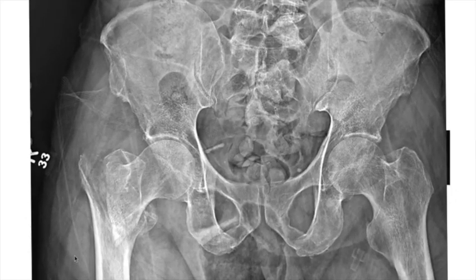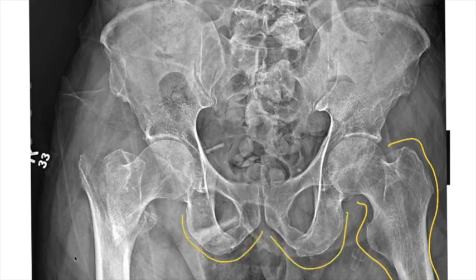Here's another example of a pretty significant fracture, and you shouldn't miss this. So if you look at the normal side, and again, you're going to look for smooth borders. Smooth, smooth. Look at the pelvis, smooth. Relatively smooth, now smooth, not smooth, right? Something's going on here. That's smooth, but this is jagged, not smooth. You have jagged lines, and this is indicative of an intertrochanteric fracture of the femur. Intertrochanteric because it's between the greater and lesser trochanters.